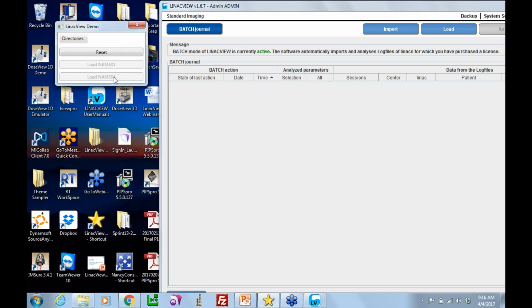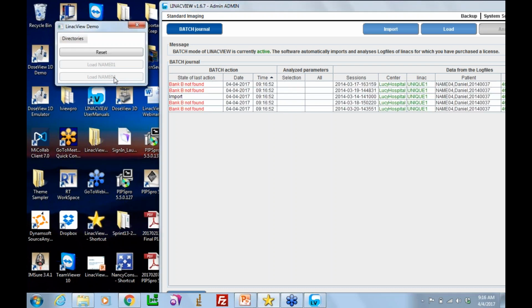I'm going to turn my batch on, which I didn't have to do in the therapist mode, but because there are so many things that you can do in administrative mode, that's what I'm going to do. I'm going to load another set of plans, and we're going to see what's going on here. How interesting. So we're actually failing on something. What are we failing on? That's interesting.